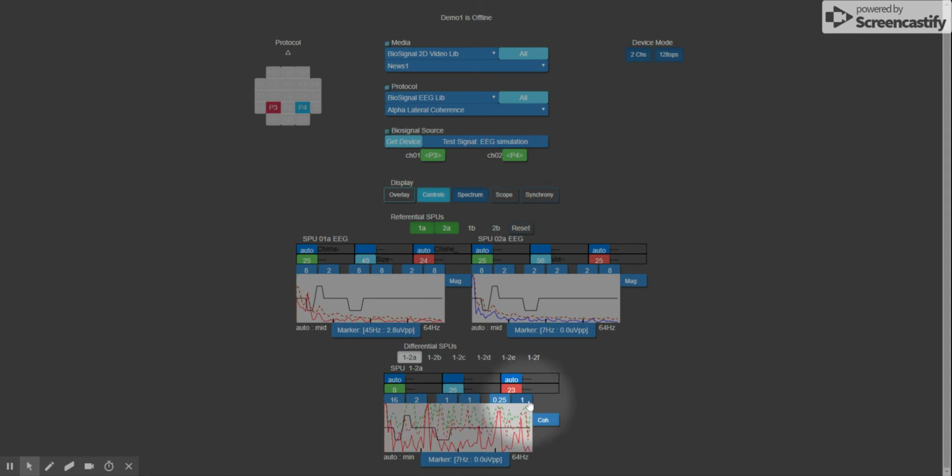This is saying it wants to generate an inhibit every 1 second. So in fact, the threshold is lower. And it's easier for the real-time signal to exceed the threshold because it wants to generate an inhibit, which is flashing here in red, every 1 second. The duration is 1/4 of a second. Here, it only wants to generate a reward every 16 seconds, and therefore the threshold is higher, and rarely does the real-time signal exceed that green threshold. So we rarely see that reward threshold being exceeded.